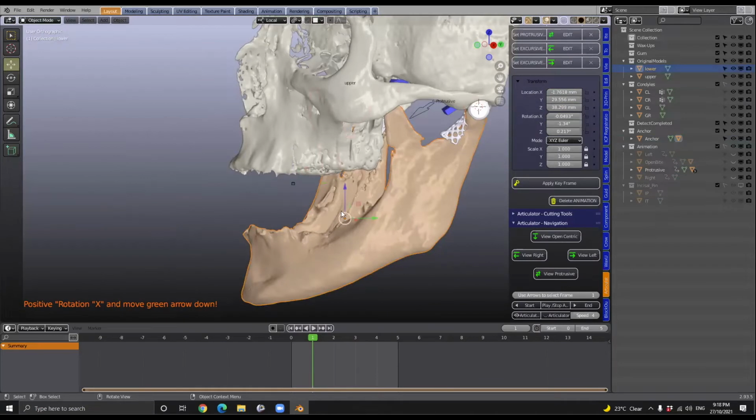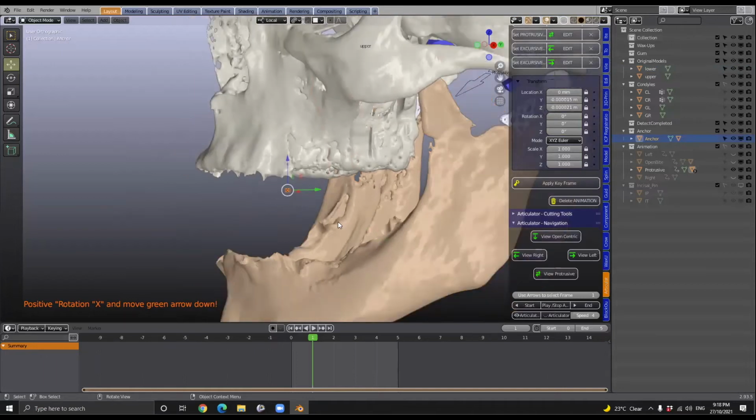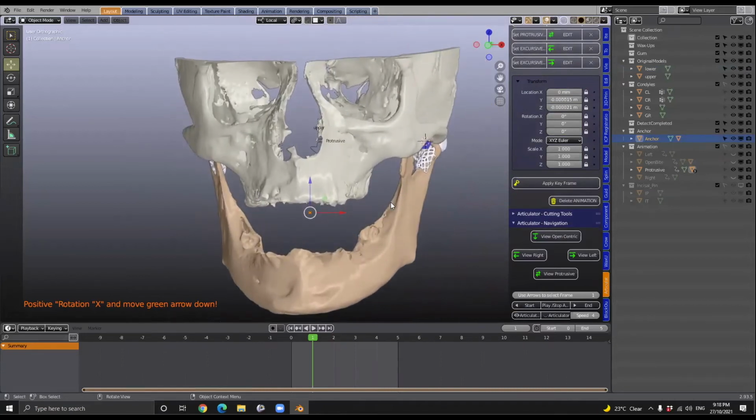Every tooth that we animate is going to parent to this little thing here, the anchor. If it's deleted, the articulator is not going to work. This is very important to know. Okay, are there any questions related to that? Because in the next file, we're going to be taking a tooth library and cutting it, because this is the objective of an articulator, to be able to cut splints and crowns and bites or whatever. Wolf, have you got any questions that you can think of?